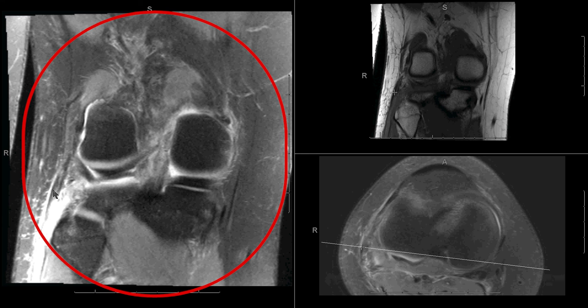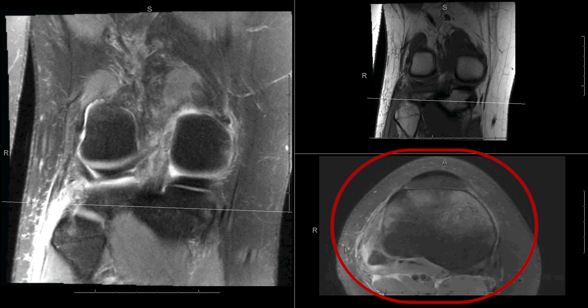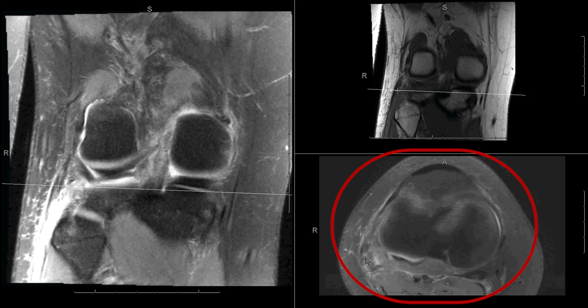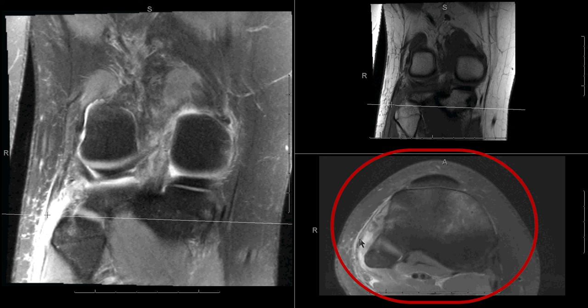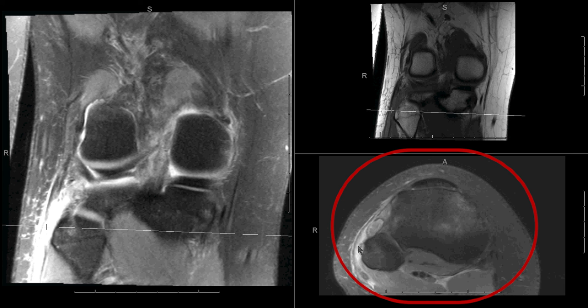Well, here's the biceps femoris tendon here, and we see the corresponding appearance here. As we start to move upwards, we see that that attaches to the muscle, which is proof positive. We come down lower and we see it sort of fades out into this abnormal signal intensity. So biceps femoris is a concern. It's either attenuated by all this fluid or it's torn.